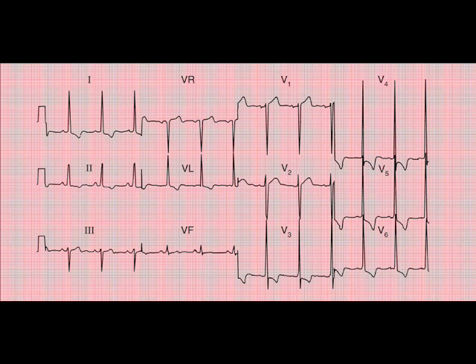But the other, of course, is the pulse rate. The fit young man, or young woman, I do apologise, could have a very slow heart rate, is likely to, whereas this patient is unlikely to. They may have a normal or higher heart rate. Of course, they could be beta blocked if they've got an underlying heart condition. The other thing is, in the younger person, the T waves tend not to be inverted. In fact, they can be quite peaky and quite tall. So heart rate would differ, T waves would differ, and obviously looking at the patient, getting your history, would show that they were a very different presenting patient.